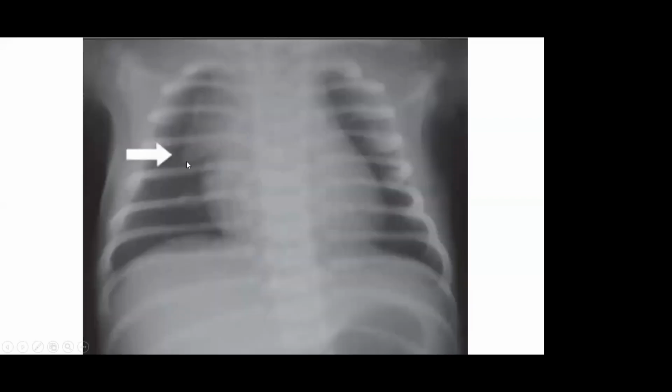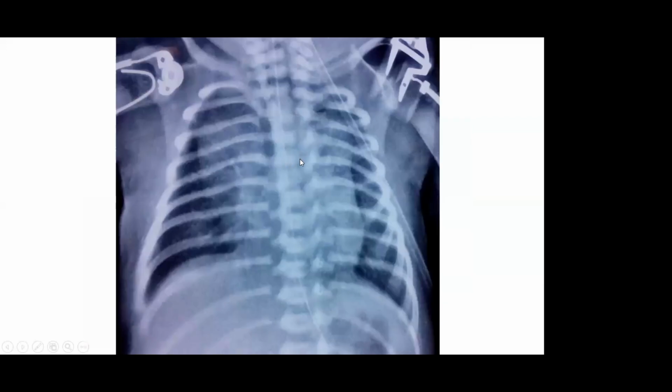This is how a sail sign looks like. Okay, so they look like a sail of a ship, and hence the name. So sometimes it may look like this. So don't start identifying, is it a collapsed lung or a pneumothorax surrounding it, or maybe a part of a pneumonia, or maybe developing lobar pneumonia. It could be just a sail sign of a thymus. Okay, thymus also can take such kind of a weird shape.